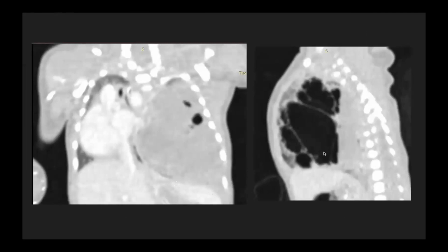And ultrasound could demonstrate it beautifully, maybe because of two reasons: it was a newborn when the lung fluid was not yet cleared. Had it been an older child or an older infant, the lung fluid would have cleared and the cysts would have been filled with air, making ultrasound a less useful modality in evaluation. So this was CPAM.